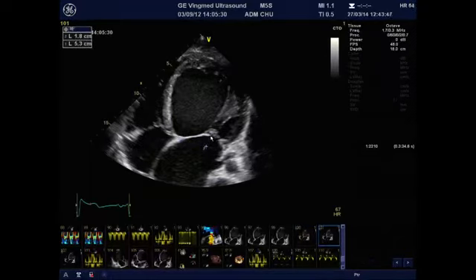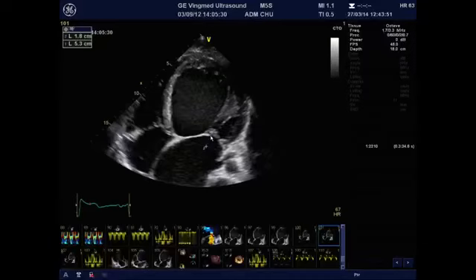When it is greater than 1 centimeter, for sure, this is again a sign that there is a severe restriction and displacement of the mitral leaflets toward the apex of the left ventricle, and often it is associated with recurrent mitral regurg after mitral valve repair.